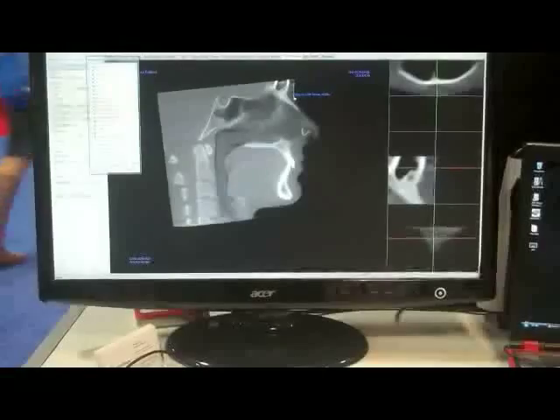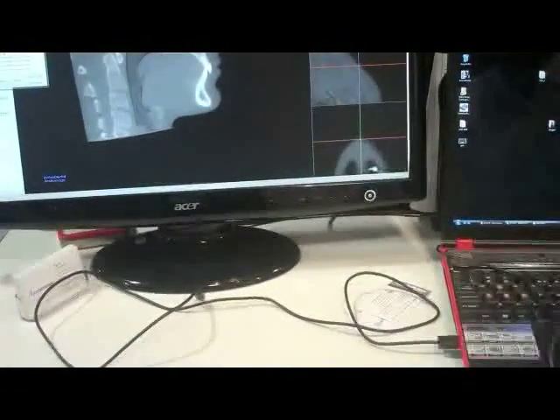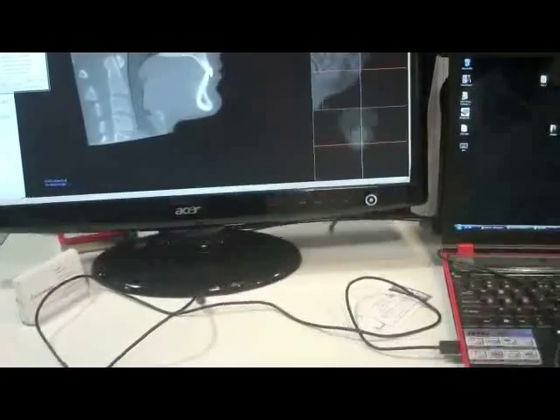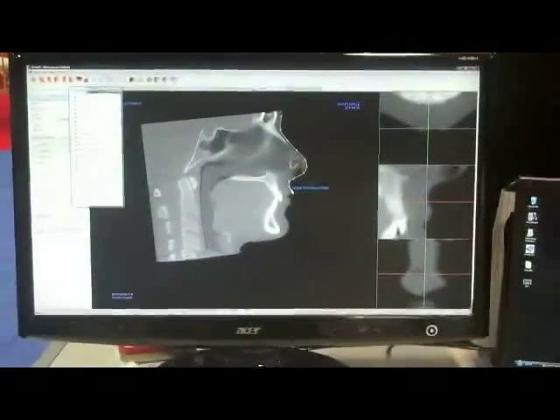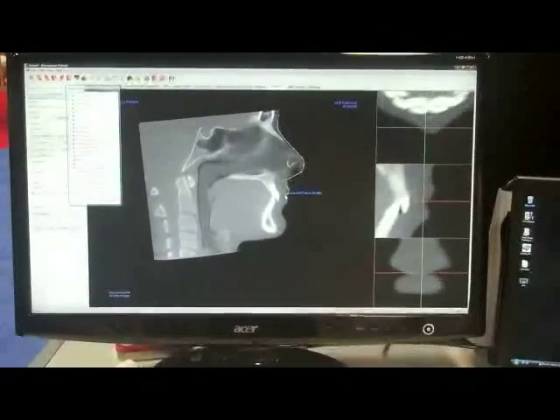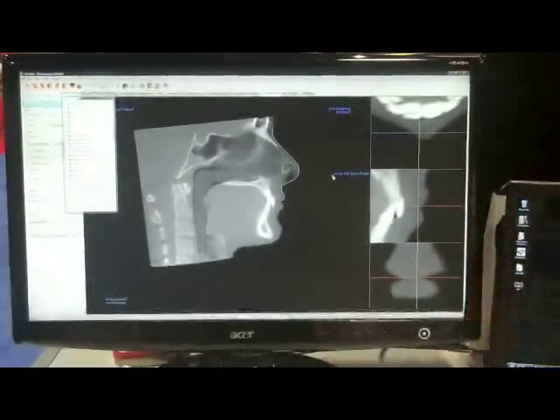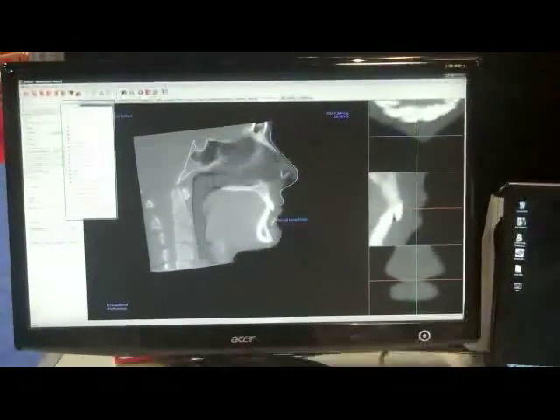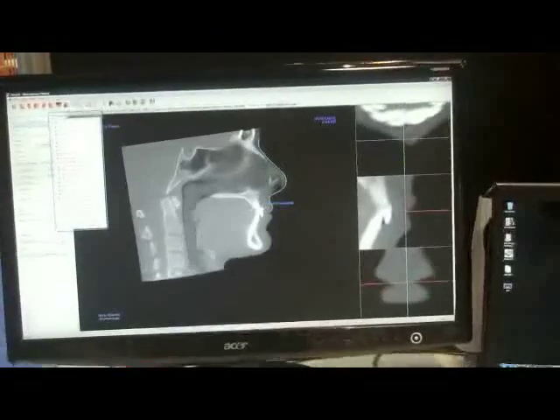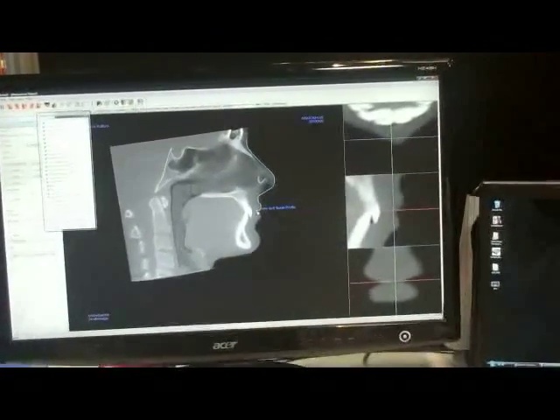Soft tissue profile. This one's a really good example of showing you how it automatically calculates your landmarks. Notice I'm putting a bunch of points on here so I can conform the line. But when I'm finished, it'll actually only give you just the tracing landmarks. It'll automatically calculate your outermost point here, your innermost point here. And then you can see that it automatically calculated A, ANS, PNS, and all those marks as well.